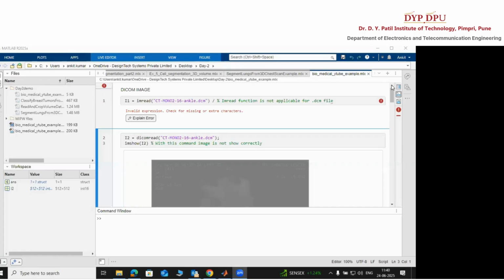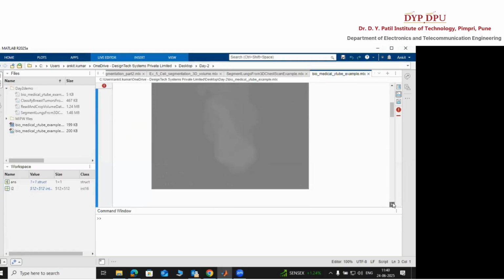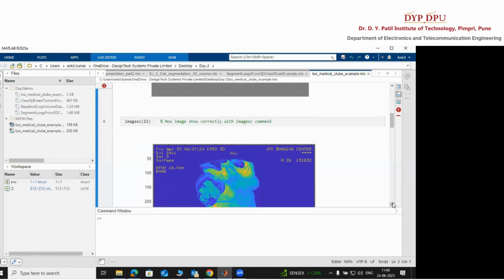Yeah, hope all of you have received this. So just pass these 2-3 commands. Okay, so 5 minutes I have taken for the setup. Now after that, pass this command. Okay, so yeah, open it. Let us open it.